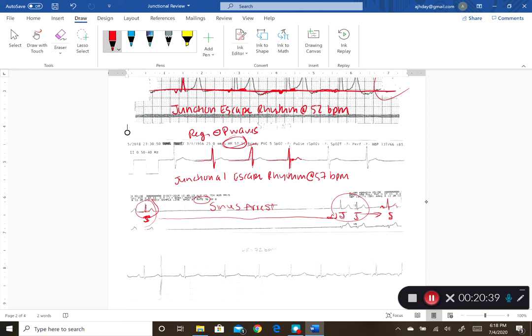Now, this patient presented very, very stable. Their blood pressure was good. I think their blood pressure is actually listed up here, 131/74. They were pink, warm, and dry, and when they had this period of sinus arrest, they just got a little dizzy, felt a little chest pressure, and then when their heart started beating again, they felt completely normal. So it was a very interesting case. When it comes to labeling this rhythm, first of all, I would never give you a rhythm like this to label on a test, so no worries.